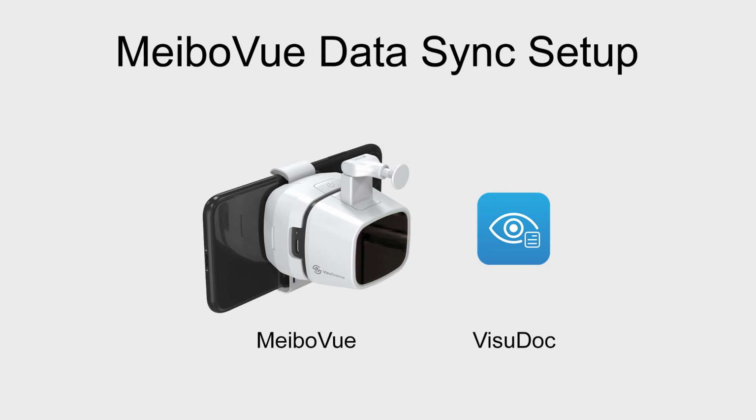Welcome. In this video, we'll walk you through setting up your MeiboVue device and the VisuDoc software, so you can start capturing high-quality meibomian gland images and manage patient data efficiently.